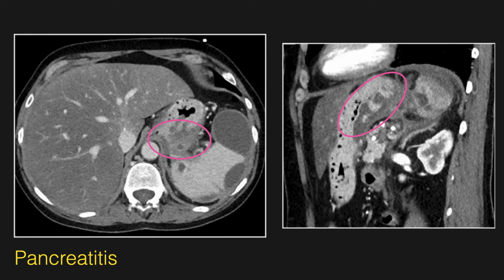In this case of subacute pancreatitis, pseudocysts are dissecting into the wall of the stomach, compressing it and resulting in inflammation. There are also pseudocysts burrowing under the splenic capsule, causing compression of the splenic parenchyma.